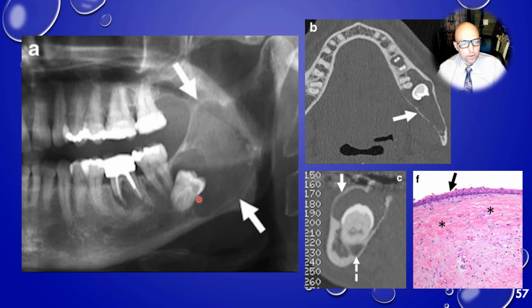Or you think maybe it could be a dentigerous cyst, right? I said those things can be difficult to distinguish. Attachment of the CEJ, attachment a little bit lower than the CEJ here. And as I said, I'm not going to delve too much into histopathology at this point. But an OKC has a lot more of a distinct epithelial lining, a palisading basal layer.